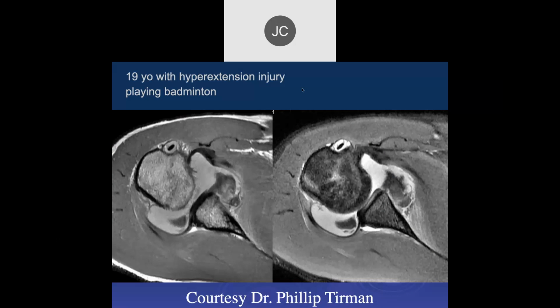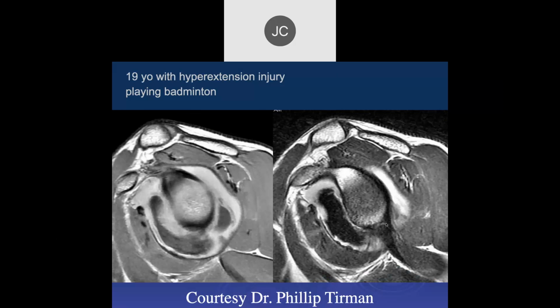I guess there is some injury to the anterior inferior labrum, but I still think that tissue bunched up. What's this? Has to be glenohumeral ligament, all right? Like, the sagittal, dislocated medially. What do you see here? I see that band of low signal tissue right there, which still makes me think it's IGHL.